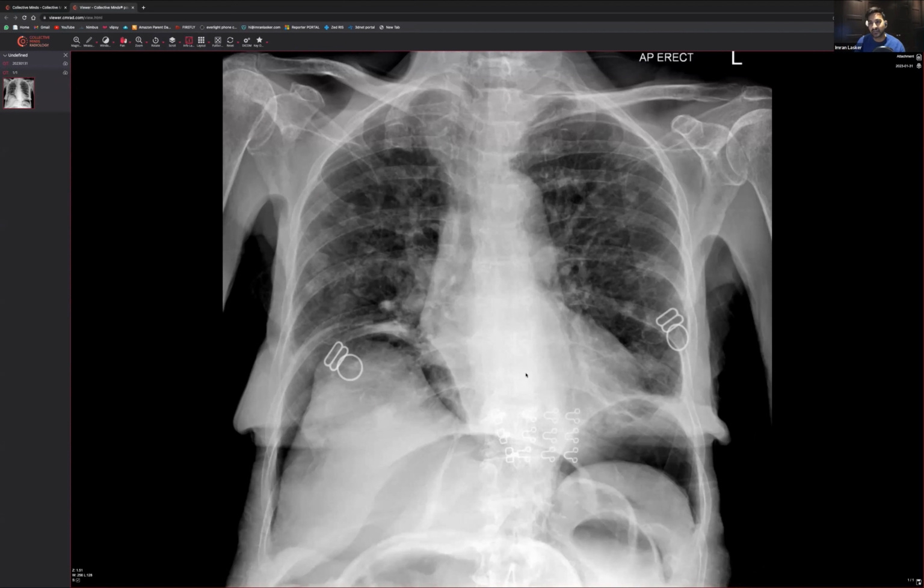And people have quite rightly said that it looks like there's air under the hemidiaphragms. When you look around here, you can see that this is one diaphragm over here, and this is one diaphragm over here. You can get air within this region, or what looks like air, because you've got the fundus of the stomach, and that lies underneath the left hemidiaphragm, unless you're looking at something like situs inversus, which is a whole other story. But you shouldn't have air on both sides.